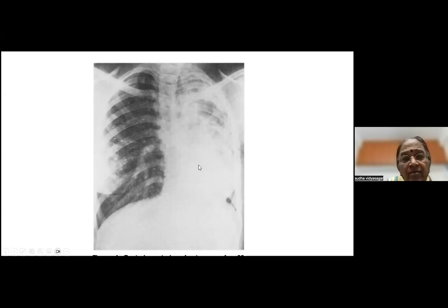Right, fine. Probably due to tuberculosis, could be old healed also. The trachea is completely on this side. Heart has moved away from the spine and is sitting here. This is probably the heart. Don't go and call this a consolidation. There's no consolidation here. Probably this is the heart. And then you got a lot of fibrosis, a lot of cavities sitting here.